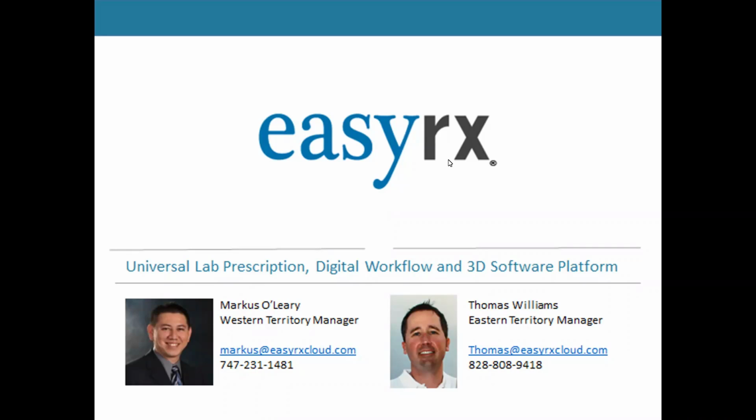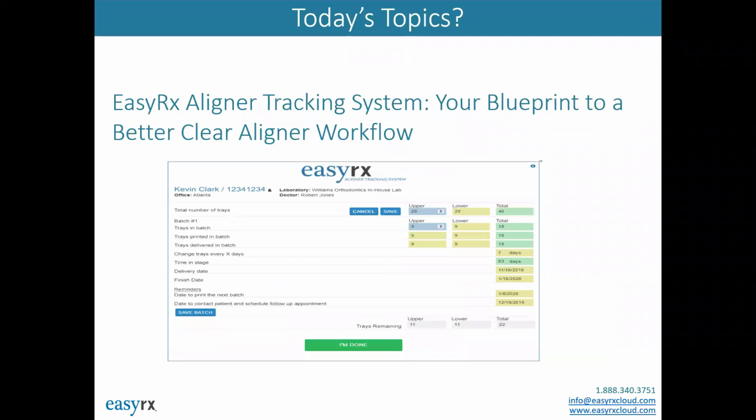So I know a few of y'all are new to the software, so before I get into aligner tracking, that's really going to be our focus today, I do want to provide maybe a 2 or 3 minute overview on what we do in general broad strokes as a company. EasyRx is universal lab prescription digital workflow and 3D software for orthodontic dental practices and the labs you work with. And again, our focus today's topic is really going to be on aligner tracking and the blueprint to a better aligner workflow for your practice. And this is just a quick screenshot of our aligner tracking system. We're going to dive into this today.